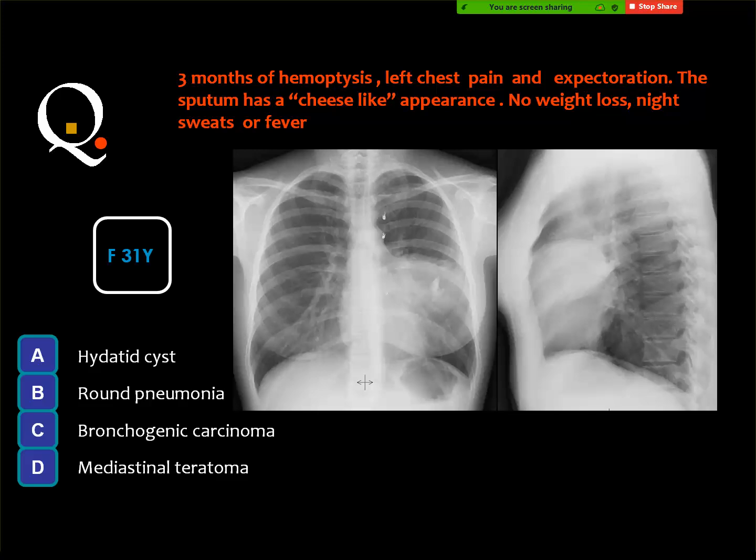A patient has a bronchogenic carcinoma, then you mention atelectatic bands as well. And a patient with COVID-19, then you mention some atelectasis and so on. But usually you avoid, because you know that the clinician may interpret this wrongly and let the patient do further investigations which are useless. Then it is better to avoid this atelectatic band except in the exam, because the examiner usually wants you to see everything in the film.